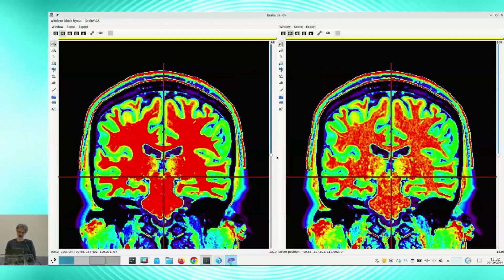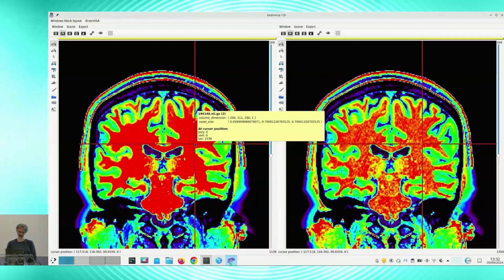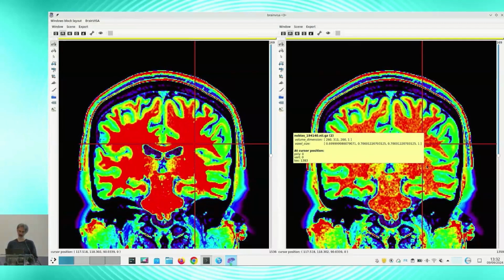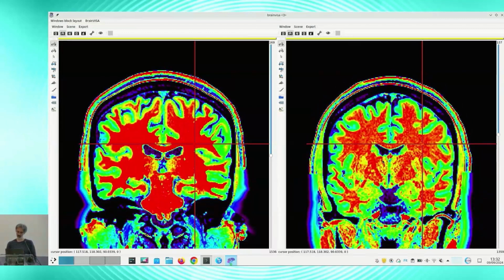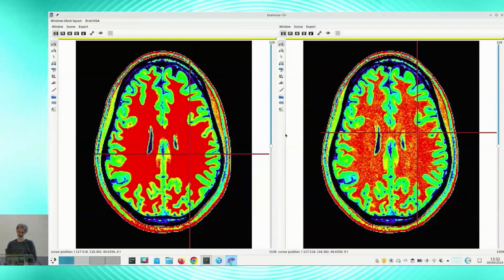It's a spatialized viewer, also based on Anatomist, and it displays the raw image and the corrected image using a color table, which allows you to see if the intensity of the gray and white matters has been homogenized along the image. You can see different orientations.